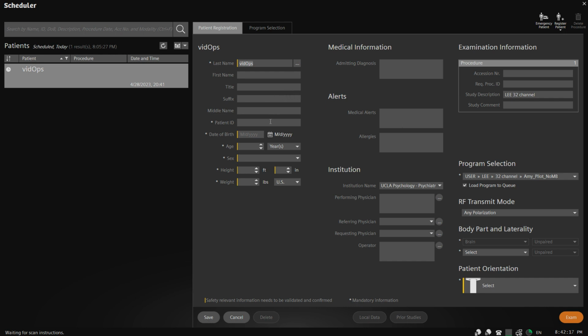So one thing to pay attention to is that there isn't one of these next to patient ID. So as you're tabbing through, you'll get this auto configuration of letters and numbers. We want to make sure that we keep this the same as the last name field because patient ID is what we find on the DICOM server. So we want to make sure we don't just tab through this, that we put something meaningful so that we can find our data successfully.